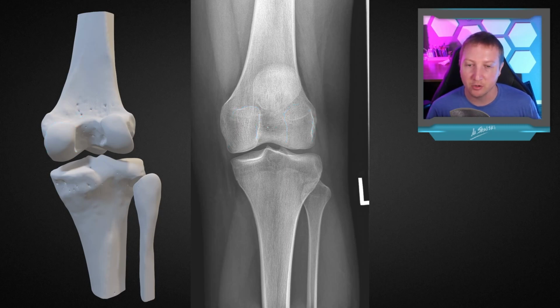And then in between those, that's our intercondylar notch. And in that space, sometimes you can make out these little nutrient foramina which come in through there. And so there's a little porosity which can almost look like a moth-eaten pattern of destruction. And you might notice that there's a similar type of appearance up here because there are similar nutrient foramina in the supracondylar region, both anteriorly above the trochlea and posteriorly here as illustrated. And out here laterally, then we have our epicondylar regions.